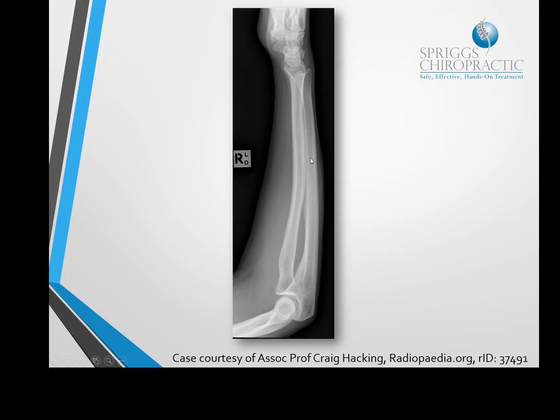So the rubber duck looks as though he's got a really, really big neck on this particular projection. And again, if you notice the curve of the radius just here, it's something that's not really appreciated in any other view. Very, very interesting to see that. In comparison, the ulna will look particularly straight. However, as we go up towards where the coronoid process is on the anterior surface, we've got a large bend in the bone just there as well.